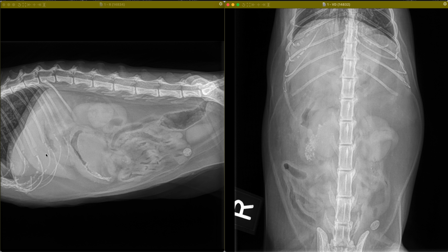The gastric silhouette contains a small volume of gas. The duodenum is partially delineated, but not particularly well defined, but does extend towards this segment of intestine. Ultimately, we identify that it becomes a little bit more dorsal to this segment, and this segment is poorly defined with respect to its boundaries.